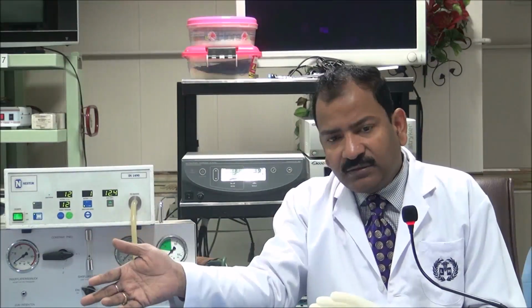Next question. Preset pressure is 12. Actual pressure is 30. Flow rate is 0. And total amount of gas used is 200 ml. Then where are we? The kink. It is blocked somewhere. Total amount 200 ml, 300 ml.